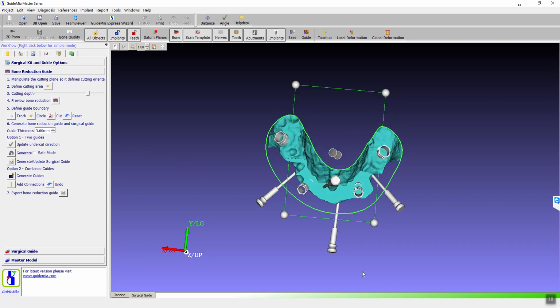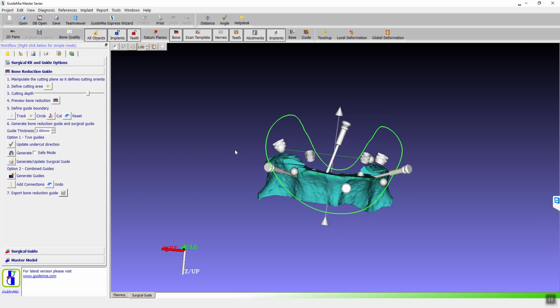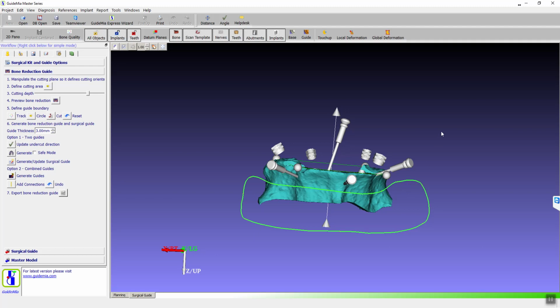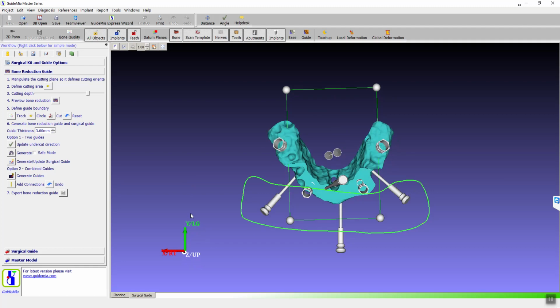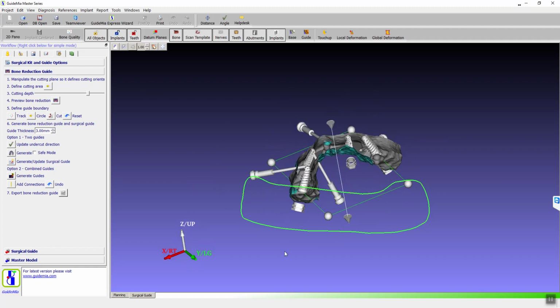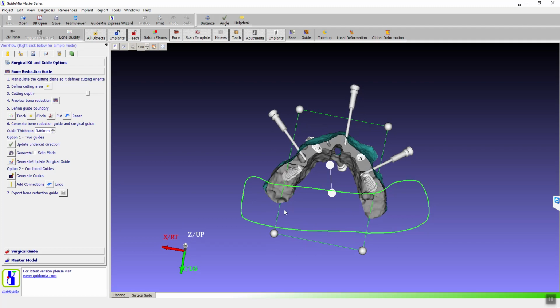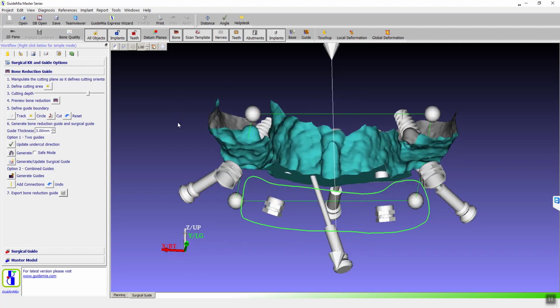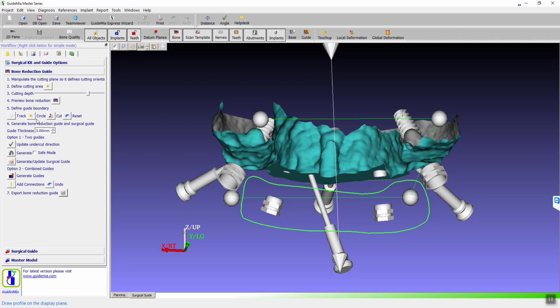One thing to remember here, if you go clockwise is to keep material. Anti-clockwise is to remove material. So if this time I'm going to anti-clockwise, it's going to remove this lower piece. We'll need to look around and find those areas like those sharp corners. We really want to get rid of those. We do the same thing here.